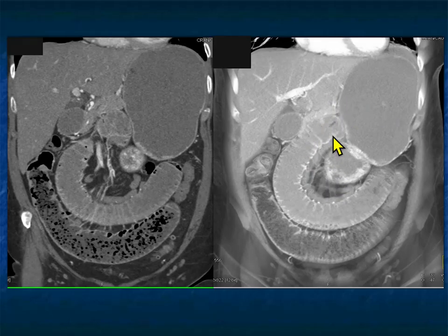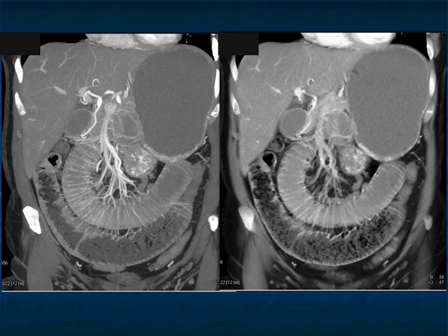Dilated small bowel, again the value of coronal imaging, you follow the bowel downward, and then right here you see the transition. Here's that feces sign, there's the transition, and what this patient had was adhesions, had an appendectomy 30 years earlier, and now had an adhesion that was obstructing the bowel. When you have that very sharp transition point and a feces sign, you really need to think about adhesions.